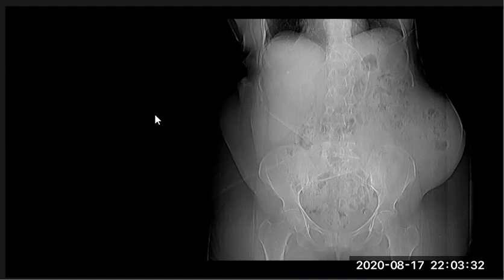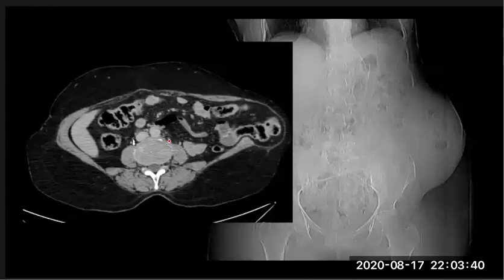Here we have the CT. The CT confirms the prior finding by showing a hernia or hernial sac involving the left lateral aspect of the abdomen, containing large bowel loops, omental fat, and vessels. There is stretching of the corresponding fascia or abdominal muscles. Okay, where is the hernia located?